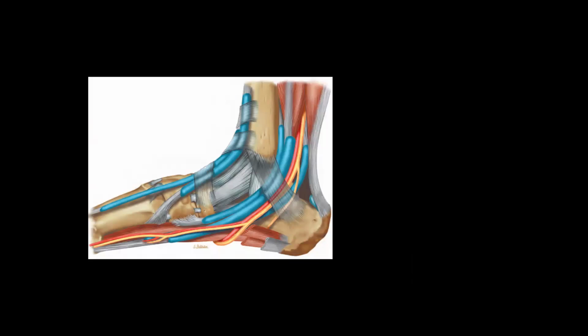This is the region of tarsal tunnel, where we can see the three tendons here and the tibial nerve and the posterior tibial artery. So this is the tibial nerve and its branches. These are the medial and lateral plantar nerves. And this is the inferior calcaneal nerve.